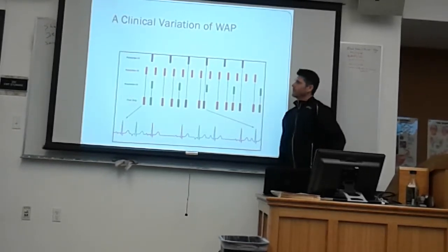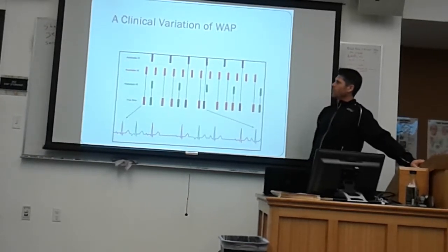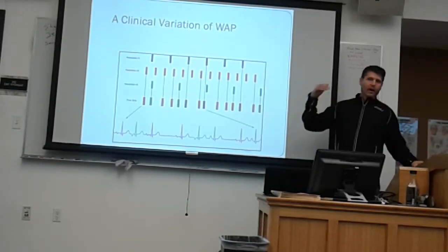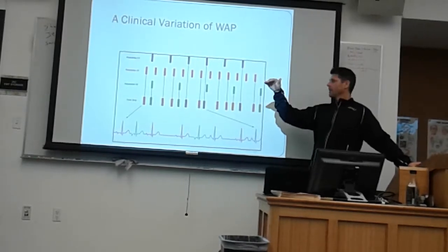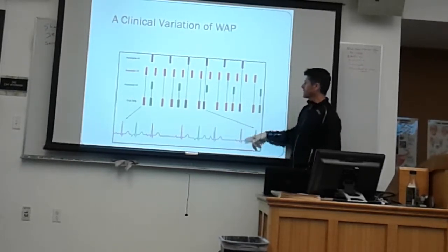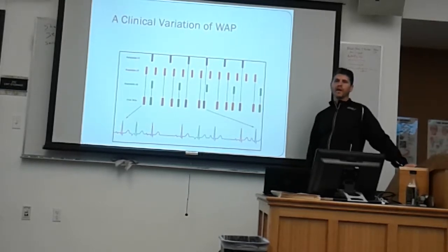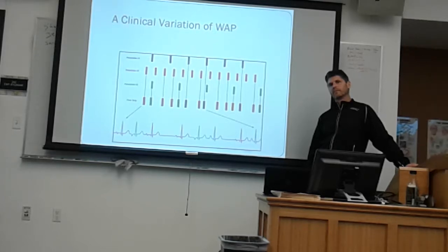And this is another version that we can have, and I showed you something like this before, right? Where you have several different pacemaker sites that are all firing, and those pacemaker sites are most likely all firing regularly in and of themselves, but the conglomeration at the end is going to be a mix of everything that's happening. Whichever ones happen to get to the AV node when the AV node is after its refractory period and ready to respond.